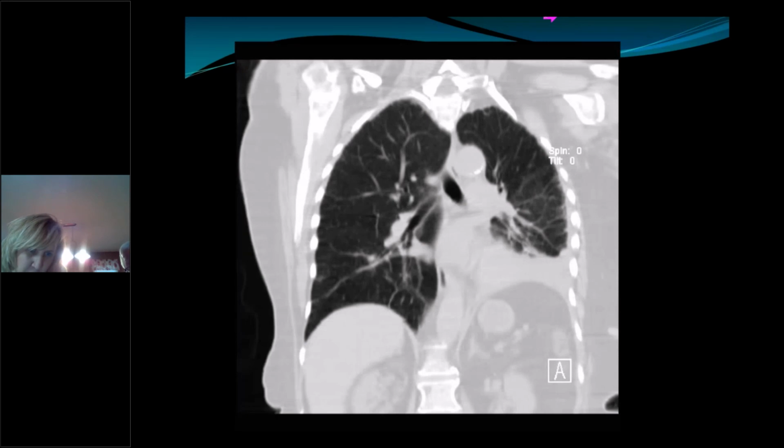This is a CT of that same patient. When we look at this, it's called a coronal cut, where we're looking straight at the patient and slicing them from belly to back. You can see all the black is the lung, and you've got the pulmonary vasculature, the white guys. You see this nice costophrenic angle. You've got the dome of the diaphragm here. And then you get over here and you see this solid density. Now, this is not a solid mass. It's more likely a pleural effusion.